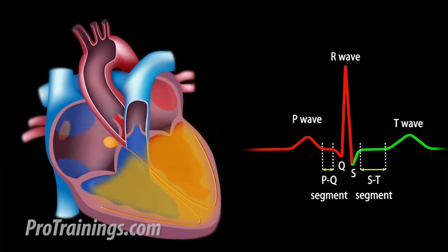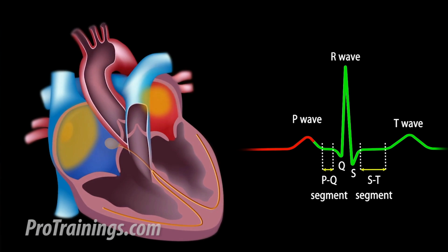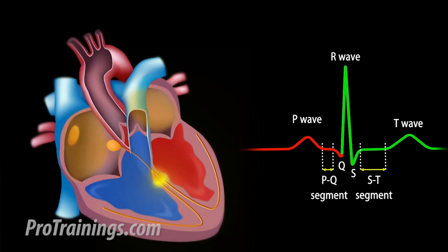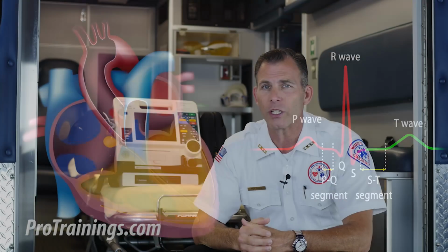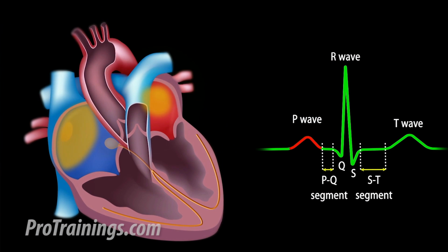An ECG waveform represents each electrical event in the cardiac conduction system during a cardiac cycle. This doesn't mean necessarily that the muscle is reacting correctly or in correlation with the electrical patterns, but simply shows that the electrical events that may stimulate myocardial function are happening. This will be discussed in more detail when we look at each rhythm individually. Now, for the following explanation, we're going to be evaluating a normal waveform and assume that normal mechanical function is occurring. The P wave, which is the first waveform in the complete complex, is normally found upright in most leads.